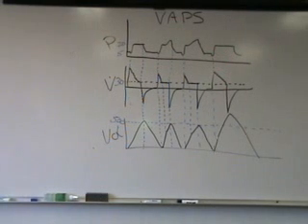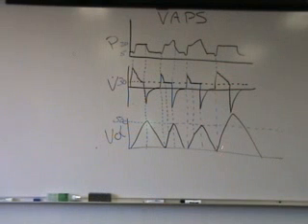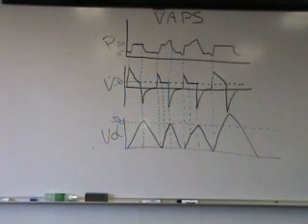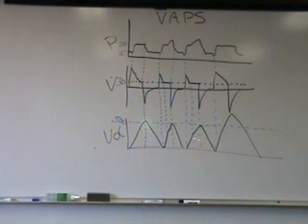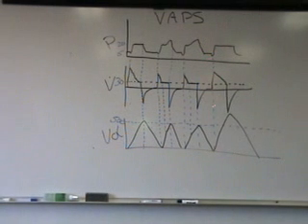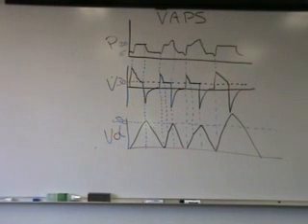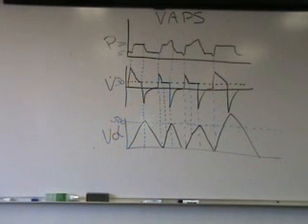Breath 4 demonstrates that a person in this mode of ventilation can exceed your target tidal volume, and the ventilator won't stop the patient. So in this pressure-supported breath, if the patient were to pull hard and take a nice deep breath, they could get a lot of flow and a lot of volume, and therefore not volume cycle.